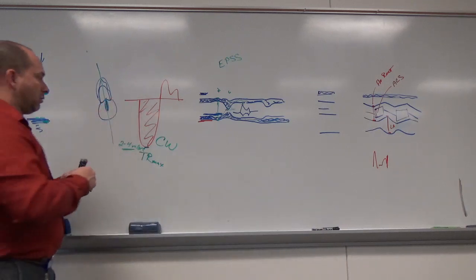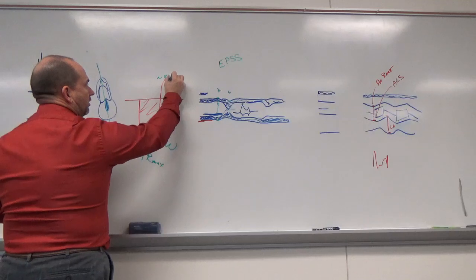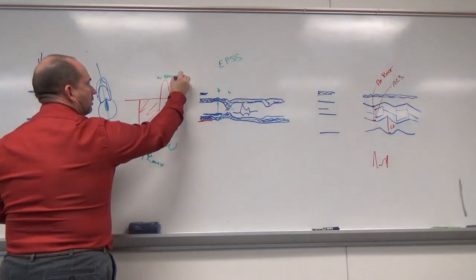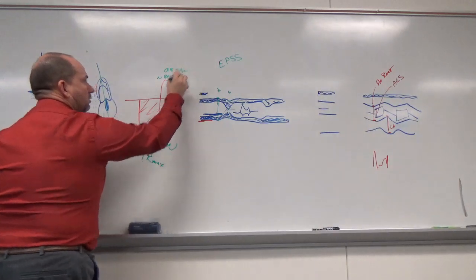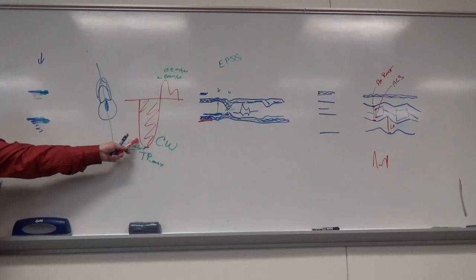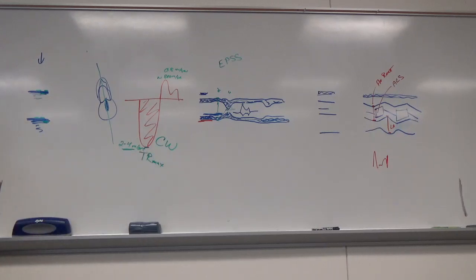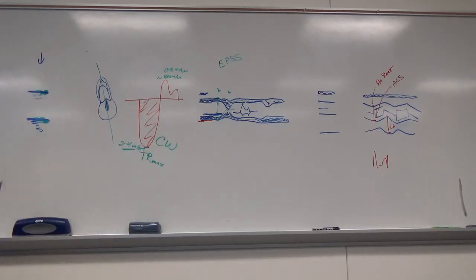These velocities are going to be, relatively speaking, like 80 centimeters per second, or 0.8 meters per second. So relatively speaking, these are like 4 times faster. So if your scale's not right, if your scale's set up for something like this, you're going to miss this. Okay, it's going to be important to catch. So that's CW.